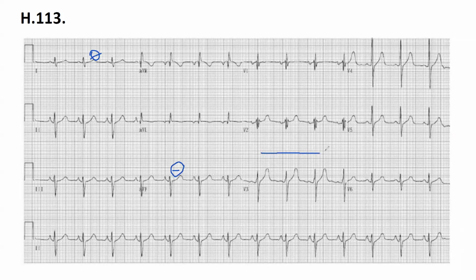AVF is negative means this. Yes, on the upper quadrant. And lead number 1 is equiphasic. It means here or here. Yes. And because you are here, that can be around minus 90.